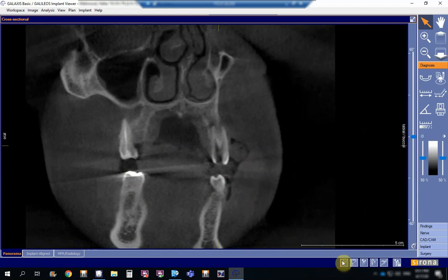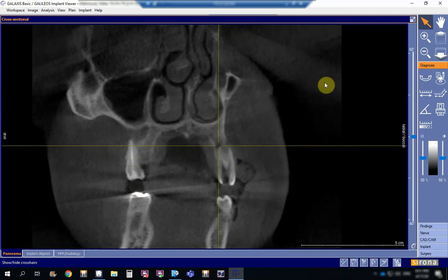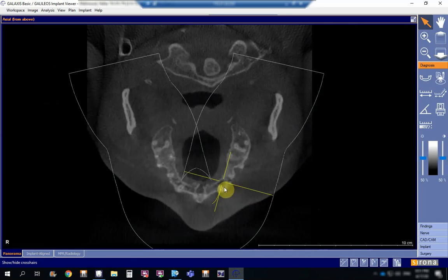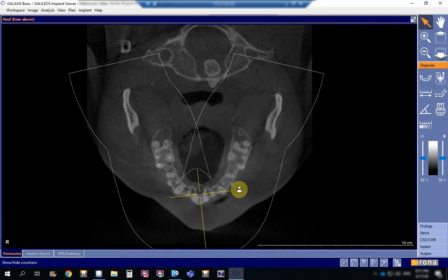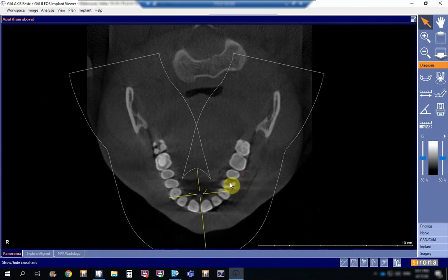Anyway, if I want to have a look at this periapical lesion, which is located at the apex, then I will just take the crosshair pin on the side that I want to see, and then I will see it in an axial view from the top, where I'll take you now. See, down, down, down, down. This is the premolar which is carious. See, it has a distal cavity over here.